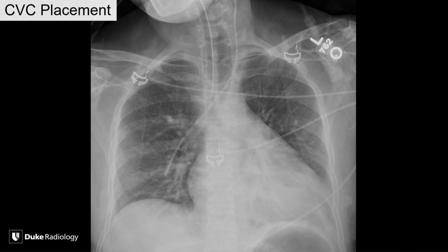Now, one of the most bizarre catheter placements I've ever seen. This is coming down, terminating out there. So the first question I asked the clinician: are you getting blood return? Because I was worried it might be extravascular. And they said, no, we got great blood return. The pulse looks like it's venous, so we have sort of a venous waveform on it. But the blood gas suggests that it might be arterial. And so that was sort of bizarre. Anybody have any idea where this one's going?